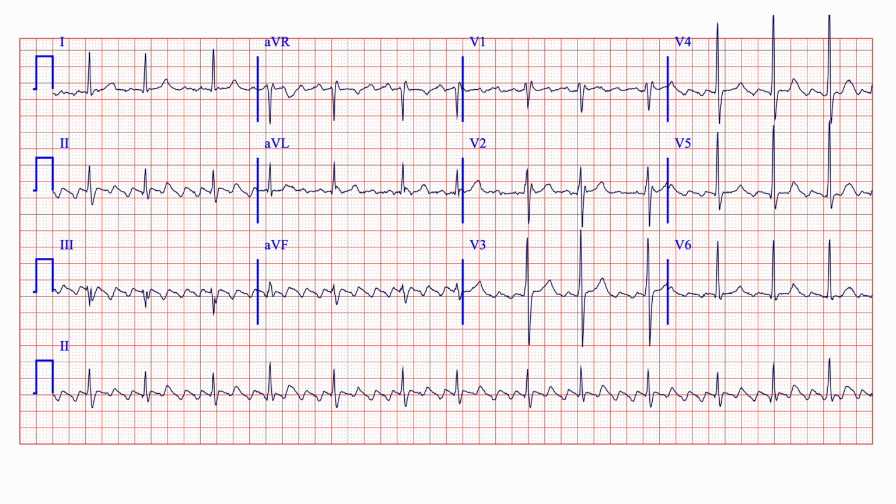So this EKG is an example of atrial flutter with variable block. We have a rate around 78 beats per minute. For our rhythm, we see no P waves and an irregular RR interval. But is this fib? We see flutter waves that are negative in 2, 3, and aVF and positive in V1, making this typical counterclockwise flutter. But then we see a variable number of flutter waves between each RR interval.